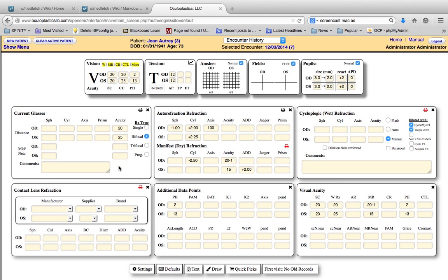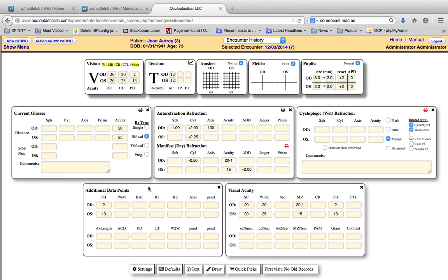And contact lenses. This database has to be built right now. There's only a couple in there, and the different suppliers that are there, and the different lenses. I don't do contact lenses, so I don't look at that, but we'll update that with lists that anybody needs, and they're fairly standard across the world, so that should be easy.